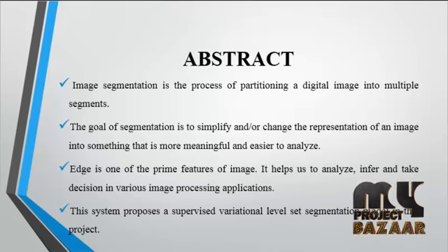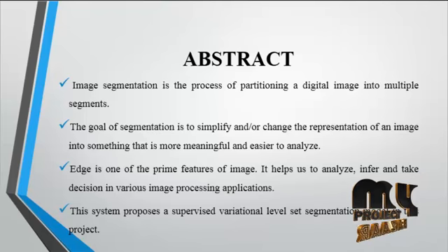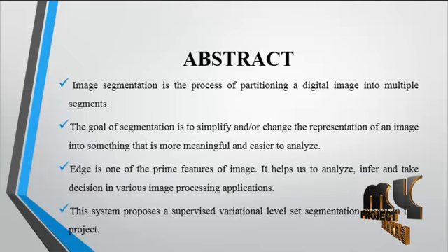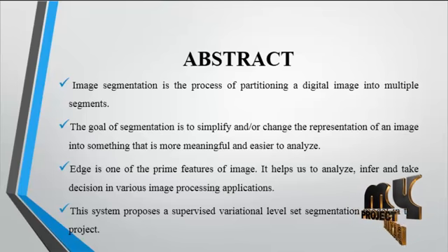This system proposes a supervised variational level set segmentation model in this project. In this process, the input feature vector is constructed with the features obtained from the stationary wavelet transform, that is the SWT coefficients. Results show that the average dice similarity index is 91%.